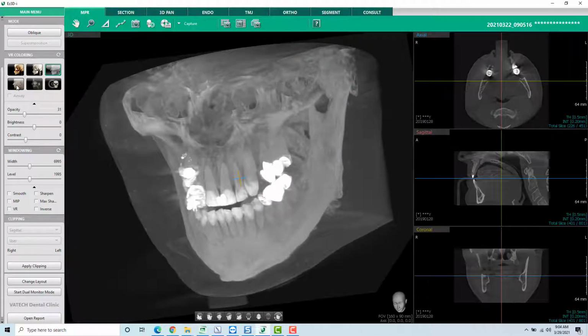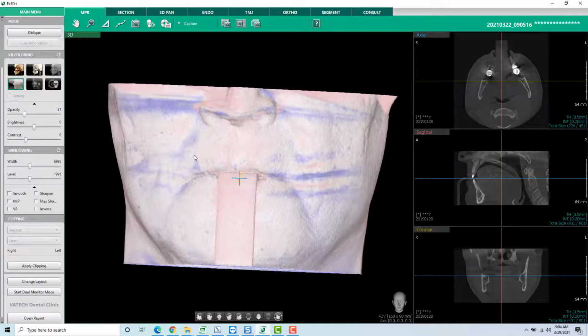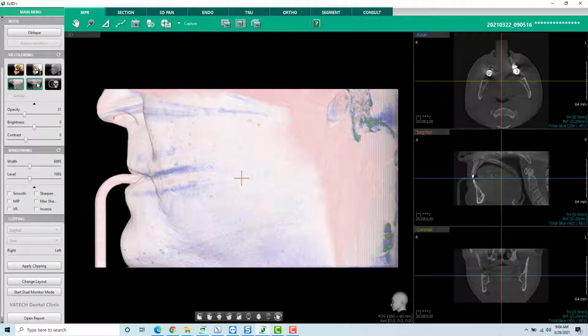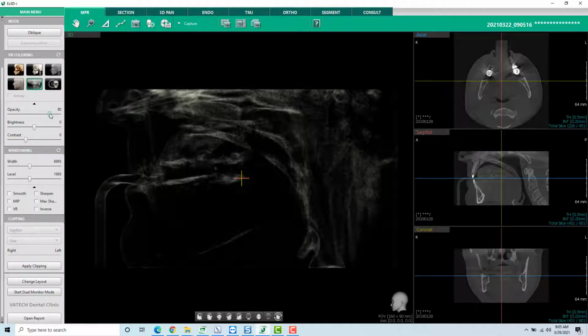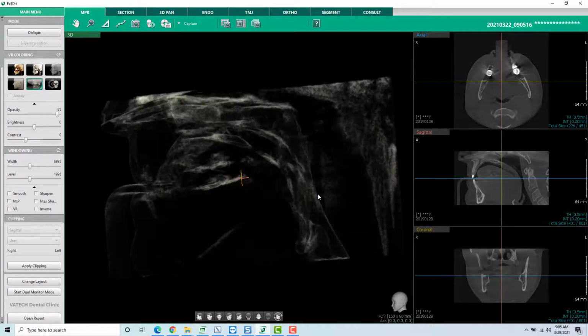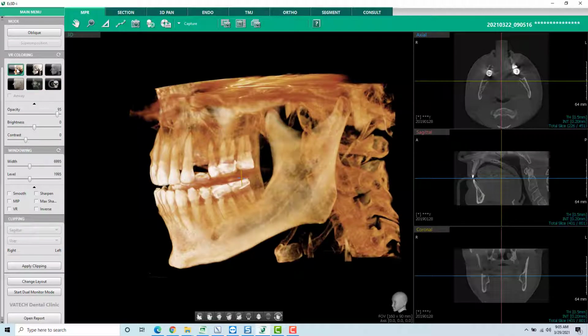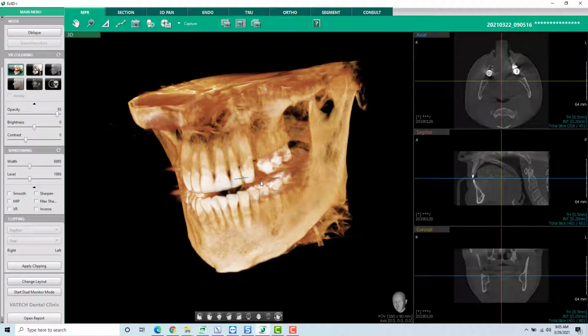We do have our soft tissue profile. Adds the patient's soft tissue here. And I have soft tissue 2, which will highlight more of our outline of our paranasal sinus and our esophagus through there. Let's take it back to our teeth mode and look at our image here.